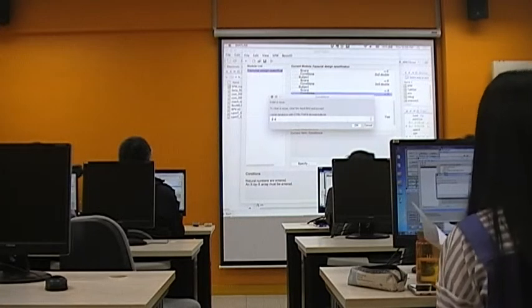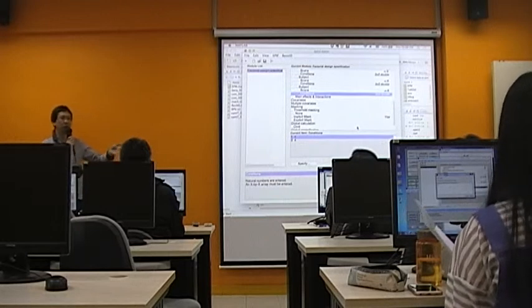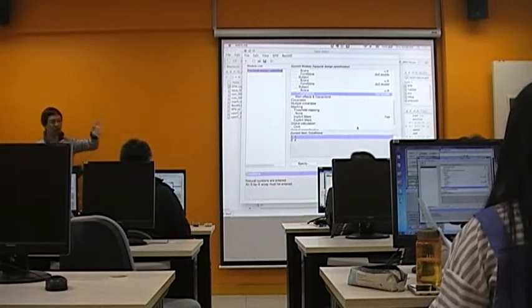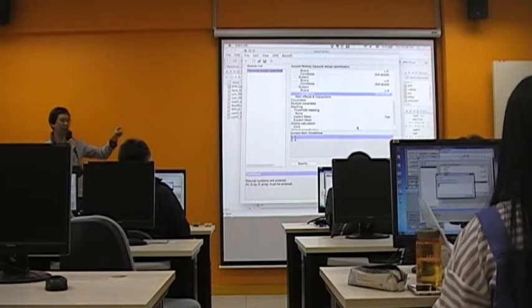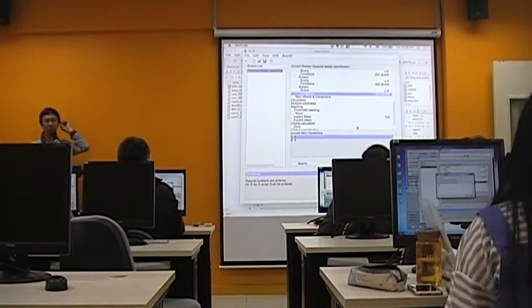So remember, if you add one more factor, then you need to add one more column in your conditions. Okay? Now for the fourth subject, because the second column belongs to the subject factor and the first column belongs to the working memory factor, the first image you put in should be the one back of the fourth subject, and the second image would be the two back of the fourth subject, and so on.